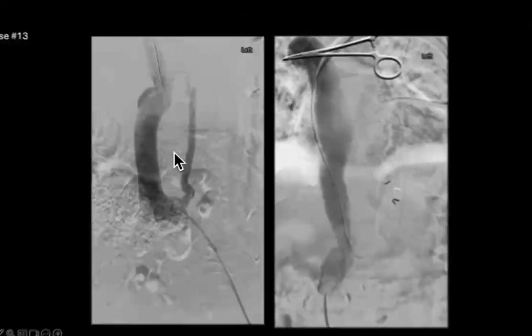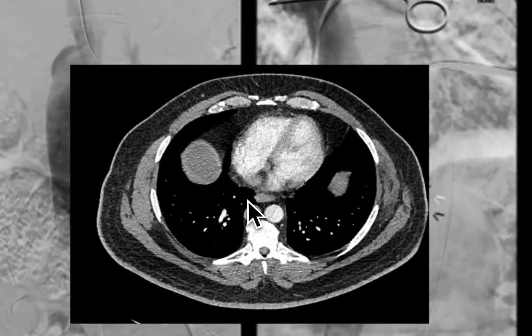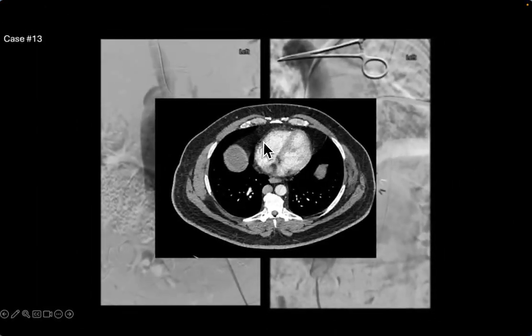So this is a persistent azygous continuation of the IVC. And here's the CT correlate. Again, what you would see is this big plump structure next to the aorta. That's not an arterial structure. Again, it's got different contrast in it, but this is that azygous vein that's basically acting as the IVC. It drains everything back into the heart because there's no IVC to drain into.